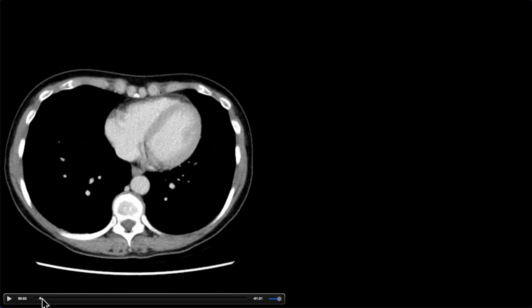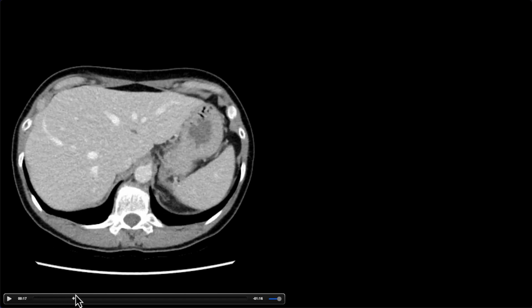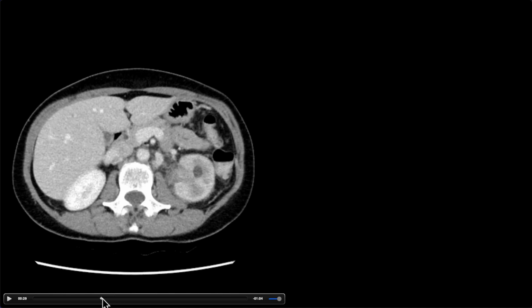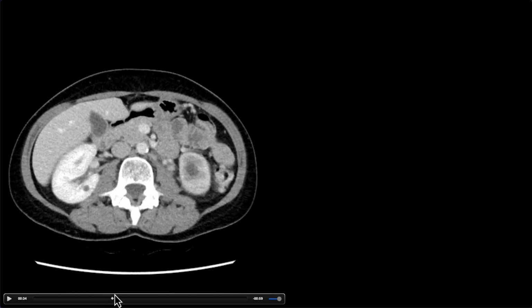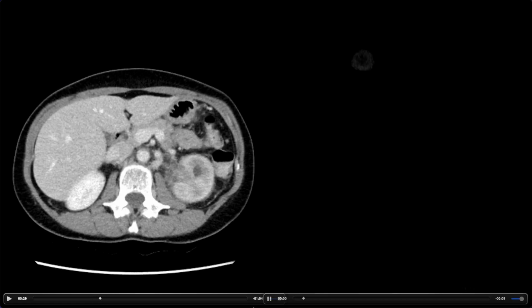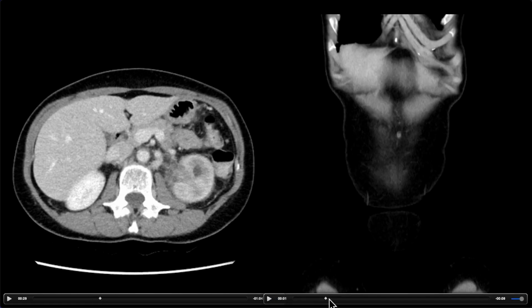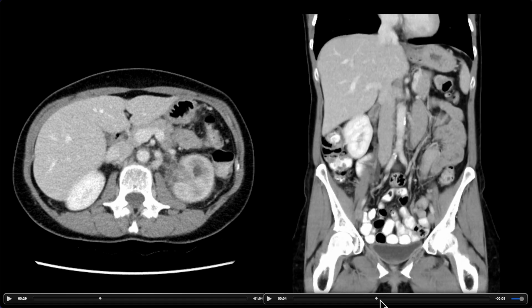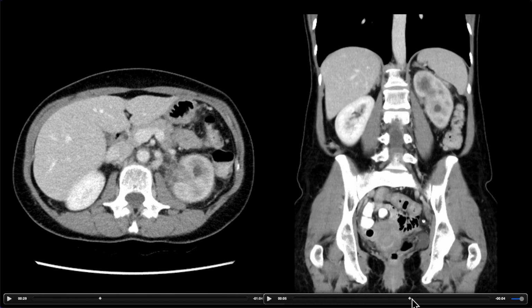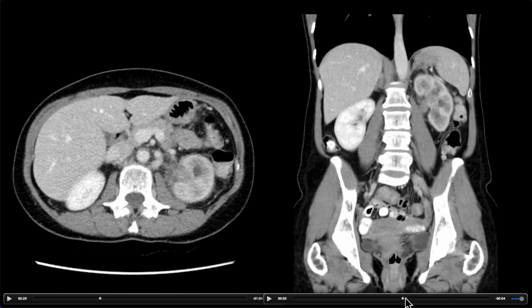All right, so we've really covered a lot of important cases related to infection, and I'm just going to show you this case here as an important variation to keep in mind. You're probably thinking, okay, I feel like I've seen enough infected kidneys. Can we move on to something else? Well, this is not an infected kidney, and that's what makes this such an important case to keep in mind. So let's get a sense of what's going on.